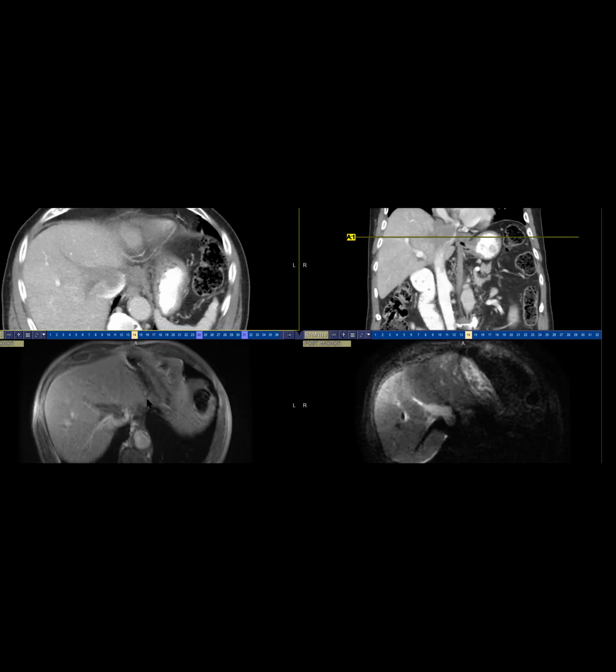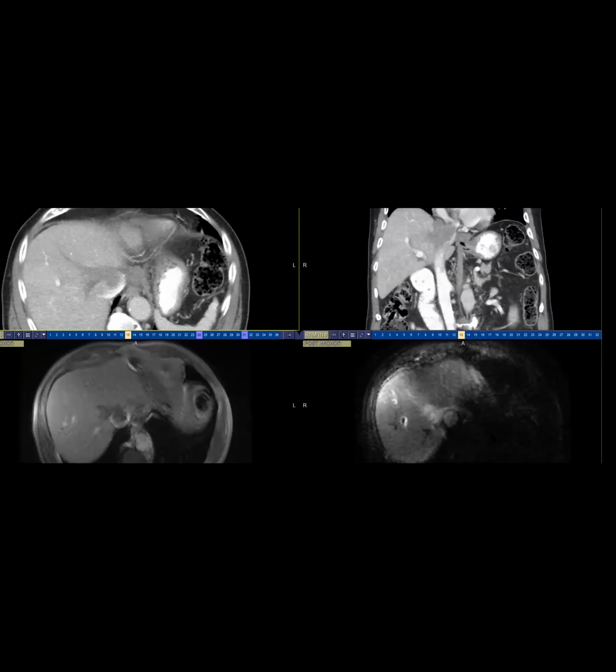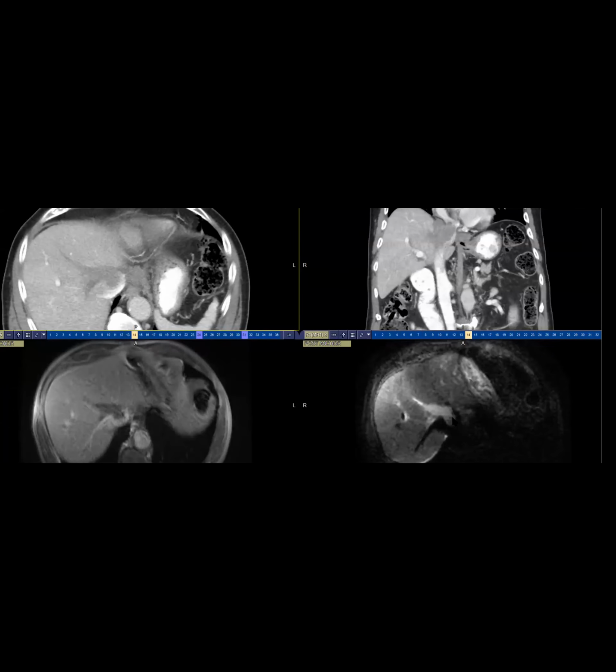And you can see, we did a contrast enhanced MR, but unfortunately it was a non-breathhold. And this was the most delayed phase. Maybe there are specks of enhancement, but not very avidly enhancing. And unfortunately, we don't have good subtraction, but definitely it was restricting. And it was restricting as much as the spleen. Any thoughts?